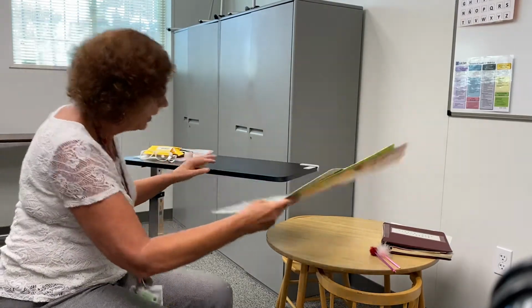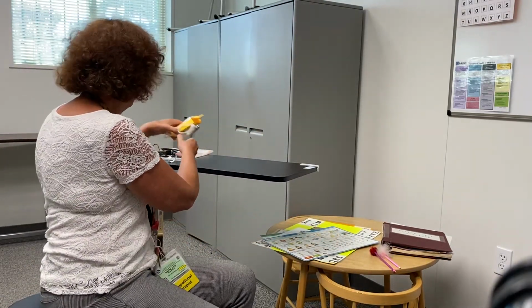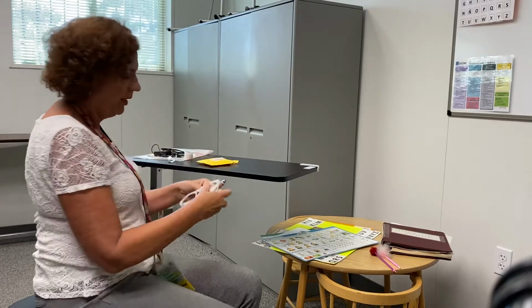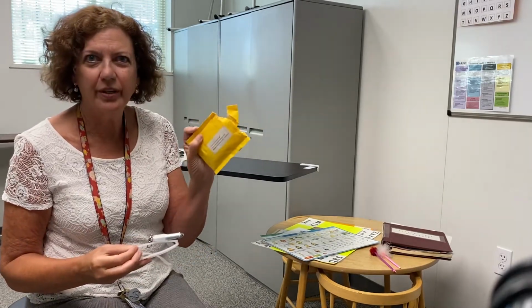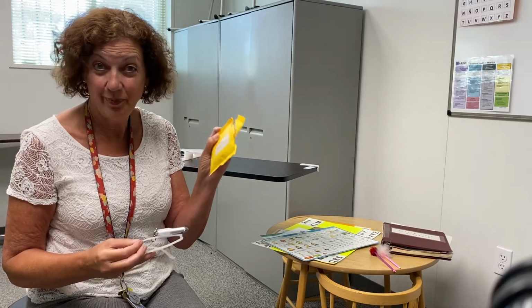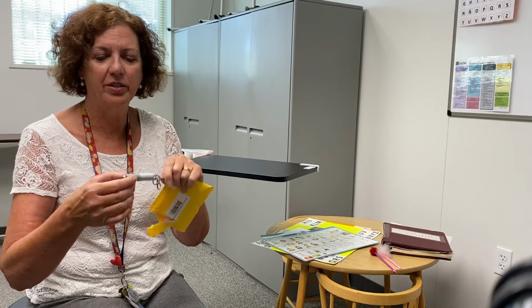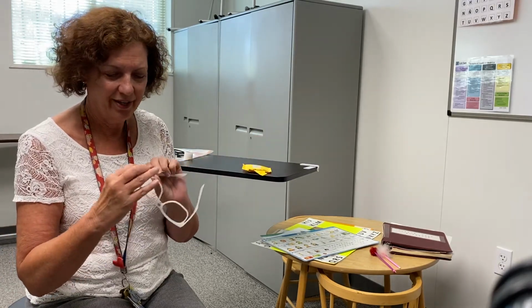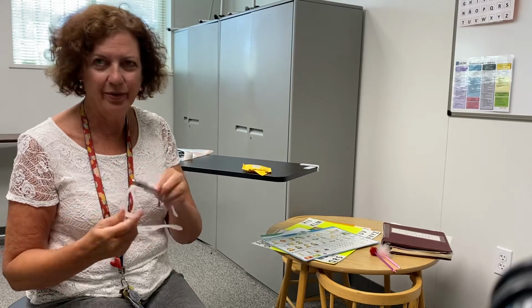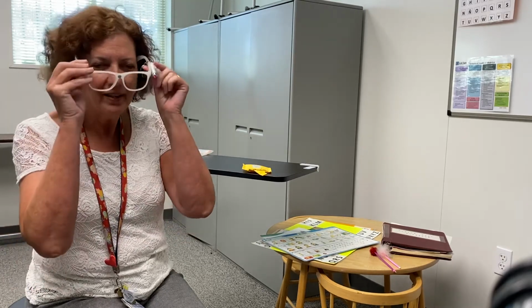Another low-tech device is a laser pointer. I actually have the laser pointer cat toy from Amazon. It looks like this. It cost me $5 for 3 of them. I think I told you in the lecture, don't go to laser pointers, go to cat toys. And I've taped it onto these glasses.